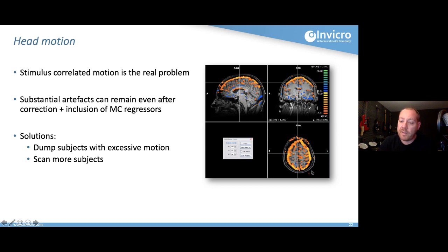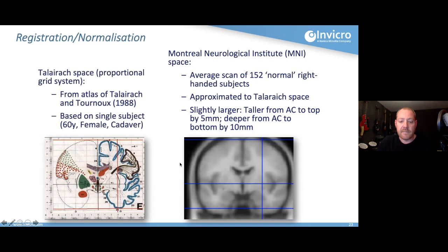And you often see them as a kind of halo around the edge because that's where you get the biggest changes in the brightness levels of the voxels. So when a bit of brain matter moves into a dark area, CSF, you get a big change in the brightness there. Okay, that's all I'm going to say about movement.